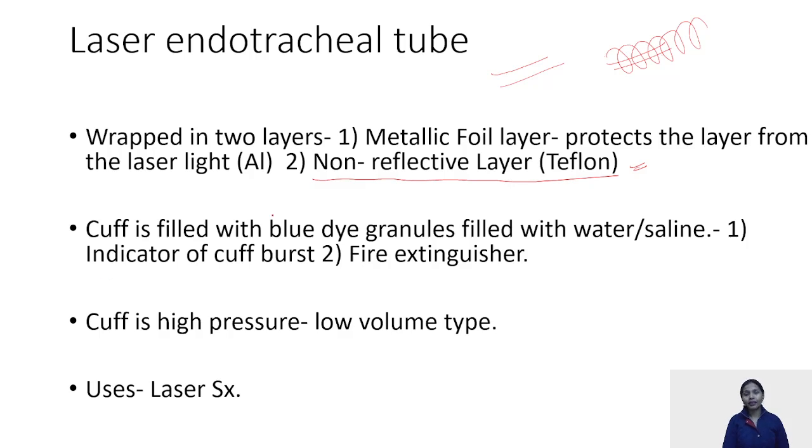or saline. I repeat, the cuff is filled with blue dye with water or saline. This is methylene blue. This helps if the cuff bursts, in two ways. First, it indicates it: you can see that some blue color is coming out of the mouth, so you know that the cuff has burst and you have to be very careful now. Second, water can be used to extinguish the fire if it has arisen from the tube.